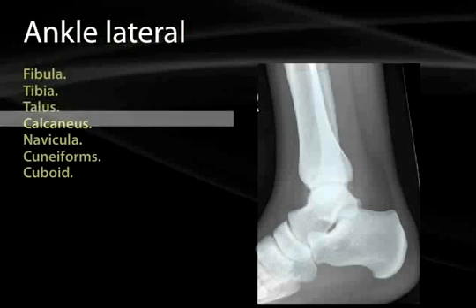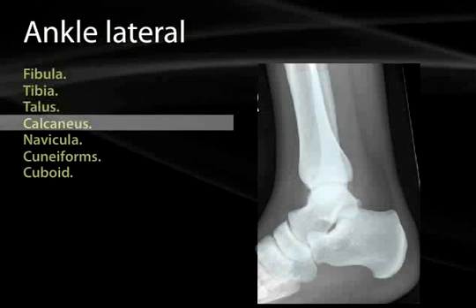The calcaneus, look for bone spurs on the posterior inferior aspects of this. And we talked already about the fasciitis, plantar fasciitis. This area is susceptible to bone spurring because of the constant tension that can happen against that plantar fascia, and may be significant for point tenderness as well. You may see even in the soft tissues of this, because you can make out the heel, there may be some densities in there from infection or being fluid filled because of edema.